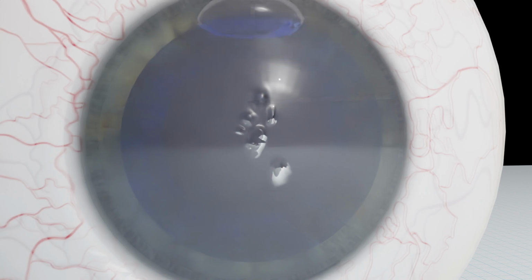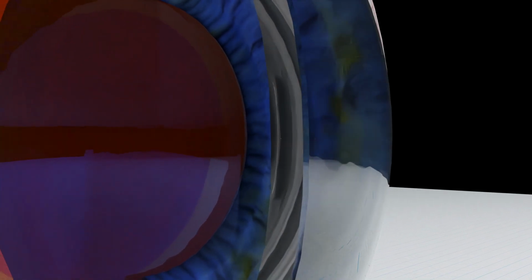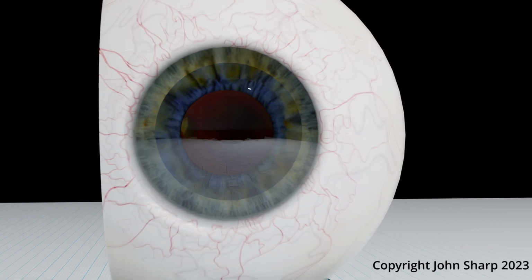It is at this point that if the graft has attached and is working, the cornea will become less swollen and the vision will gradually improve over a few weeks to months.